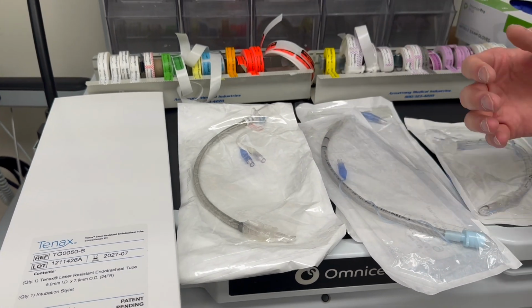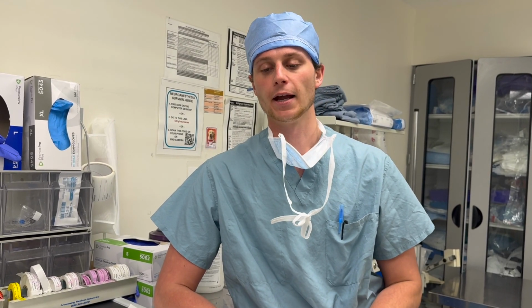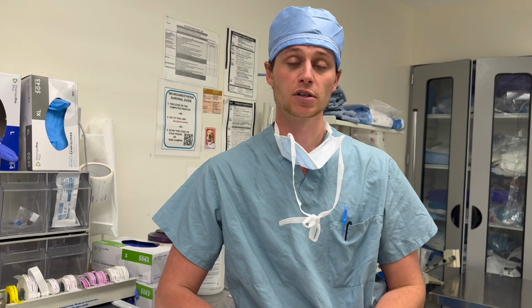During your time on ENT, it's important to discuss with your surgeon the morning of surgery, and with your attending the night before, which type of airways you're going to use. Since we discussed lasers, and we have laser resistant tubes here, it's important to remember that when they're using lasers, you're going to need to drop your inspired oxygen down to roughly 30%. It's important that you also give time for the oxygen level to drop, because if you switch it to 30% as soon as they are ready to go, they're still going to be breathing a higher percentage of oxygen than the 30%. So give them time. If you know they're going to be starting to use the laser soon, turn your oxygen down, let the patient breathe it off to make sure you're safe, and you're going to do everything you can to prevent airway fires.